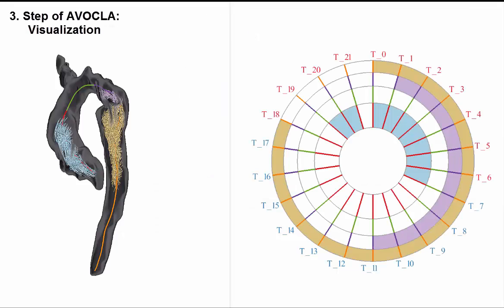Besides a tabular representation, the experts want an adequate visualization of the classification results, in order to verify and interpret them better. Therefore, we developed a 2D plot and a 3D glyph-based visualization that show the calculated vortex properties. The 2D plot allows an occlusion-free depiction of the spatial temporal vortex behavior.